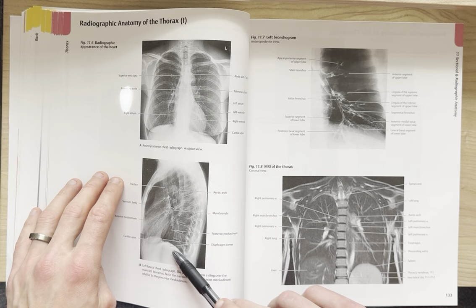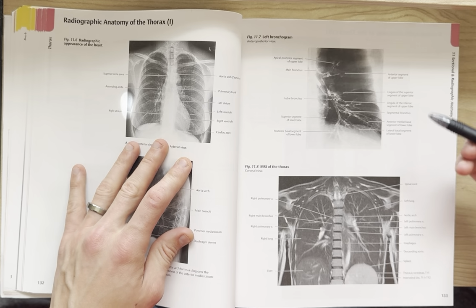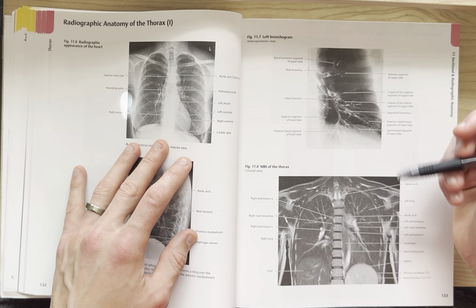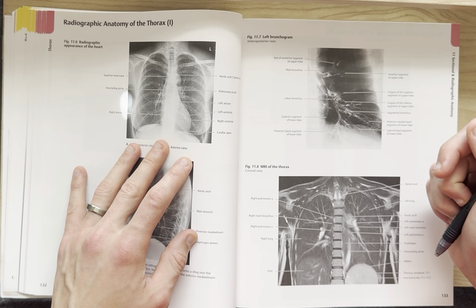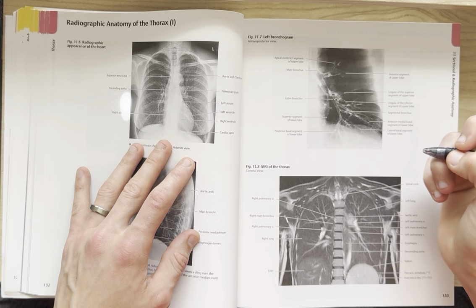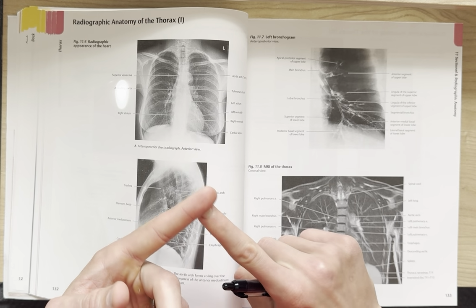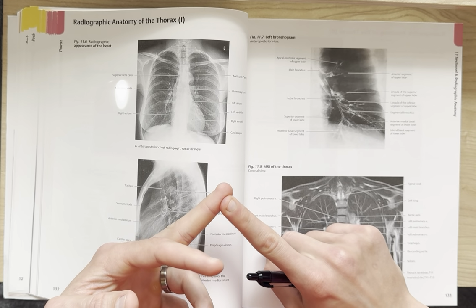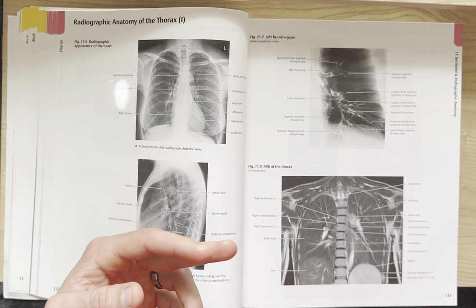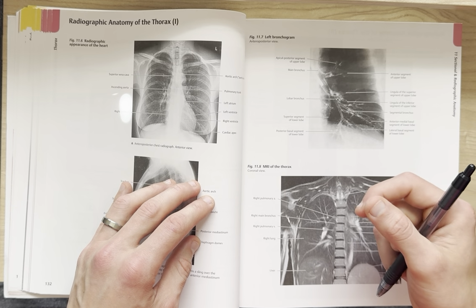So if we were to look closely, or even have better resolution with an MRI, we could probably see the central tendon right here. And here's a left bronchogram. So we're getting imaging of whether or not there's any occlusion or issues for the patient. More often than not, something like this would occur to rule out a pulmonary embolism, but it might also be a byproduct of imaging to see the severity of pneumonia if someone's hospitalized with pneumonia.